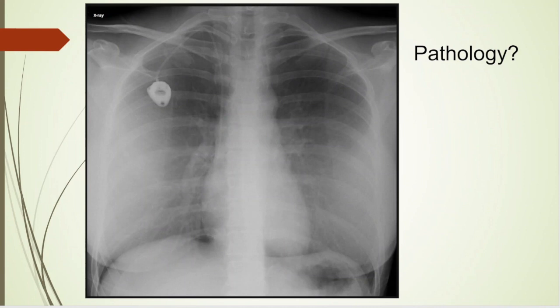All right, so here is a chest X-ray. And let's start at the beginning. A for airway. Here's the trachea coming down. A little difficult to see, but I believe this is probably carina. If we count down, here is the first rib and second rib. So that would be T2, T3.